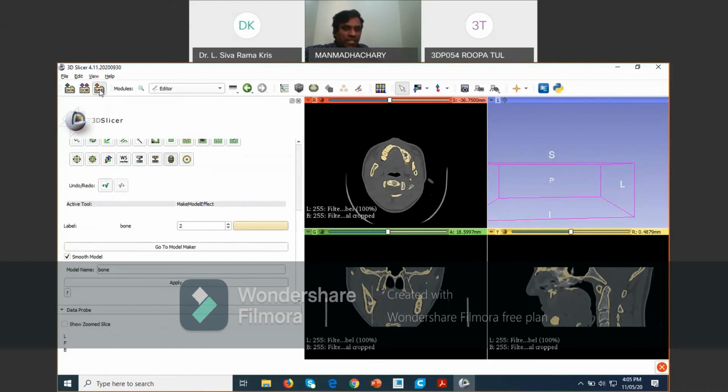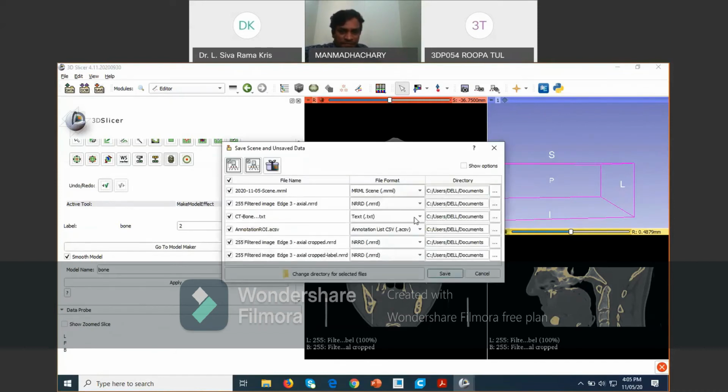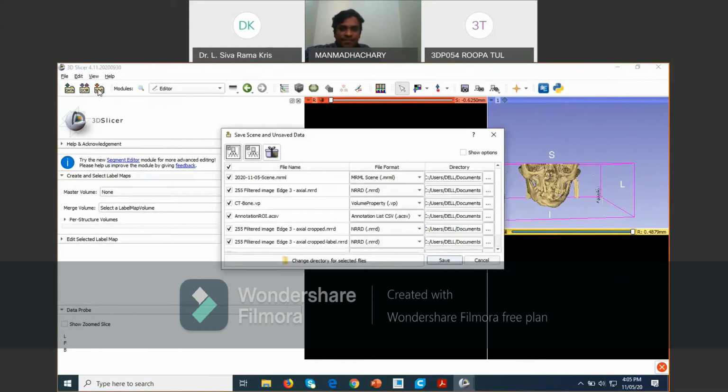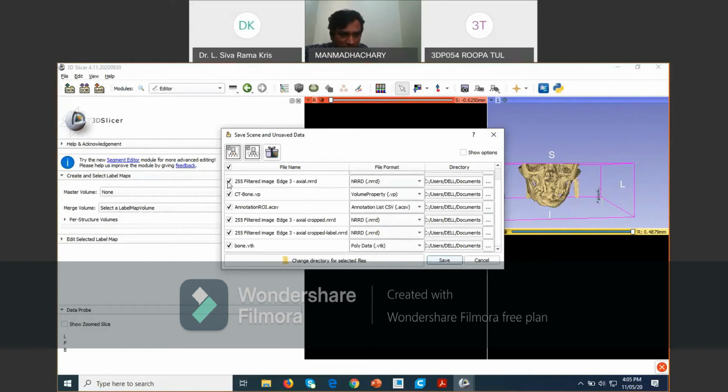Okay, then go for the save. Sir, save, where is the cursor? Yes, save. Okay. Save. Yeah, the bottom one. Then okay, here you can see the bottom. Now just here, the last one, the bottom extreme, bone.vtk is there.